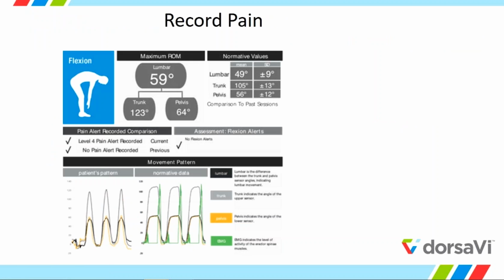So actually, this slide's in the wrong spot, I'm sorry. This is supposed to be during the live assessment, but it's a good one to know. And again, I apologize, but during the live assessment, you can record pain. So while they're going, if they have pain, you just have them tell you the number, and you just click that number on your keyboard, and it'll record pain.